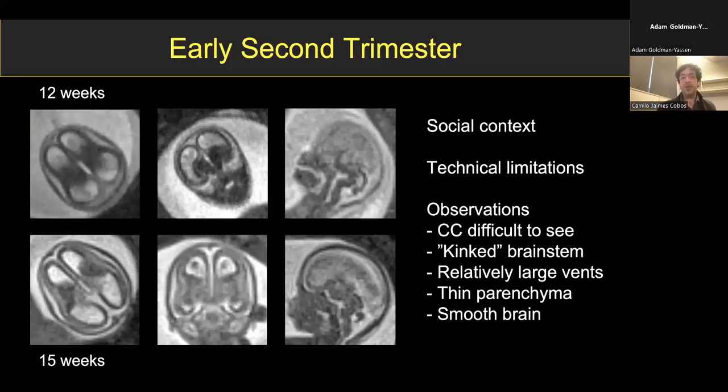Also on the neuroscience part, I wanted to show you an example because it's very different. So I think it's very important to not be alarmed at the moment if you can. My take on this is they have a very low negative predictive value, meaning it's very hard to exclude that any malformation will develop here.